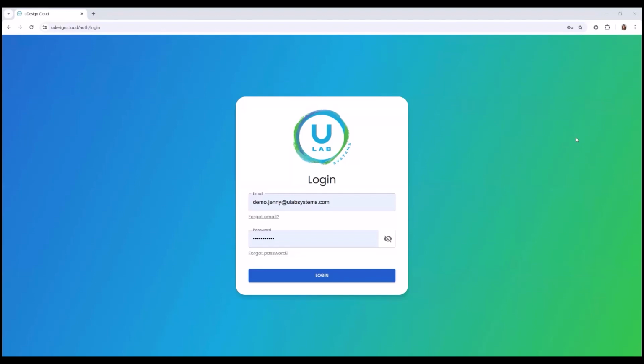uAssist Case Review and Modification Request tutorial. Log into your uDesign Cloud account.